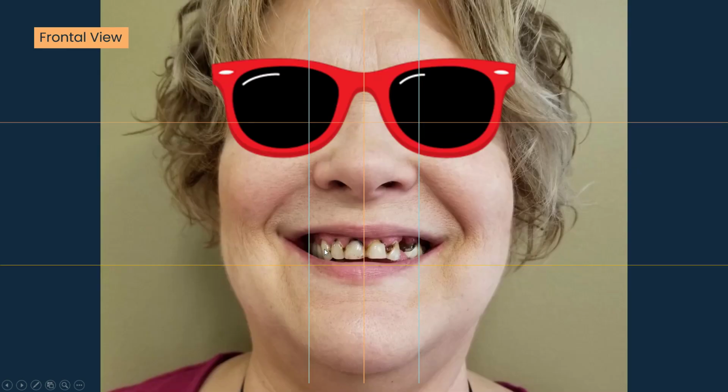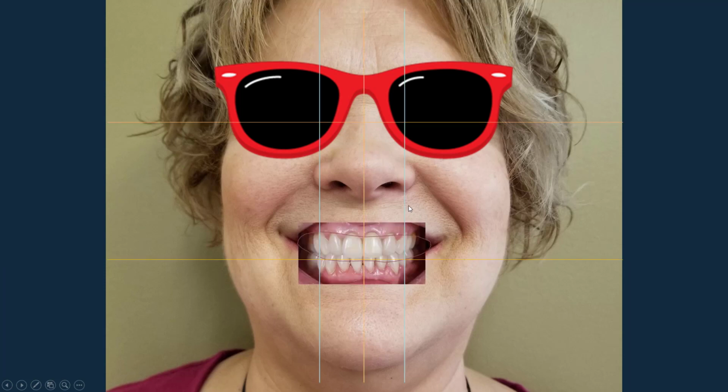And if you look back at her original starting point, she's got kind of a square-shaped arch. So it's pretty flat across the front six here and then turns pretty abruptly, and there's not a lot of width in the buccal corridor. So I thought initially fixing that would improve things, but man, when I look at this, it just does not look right.